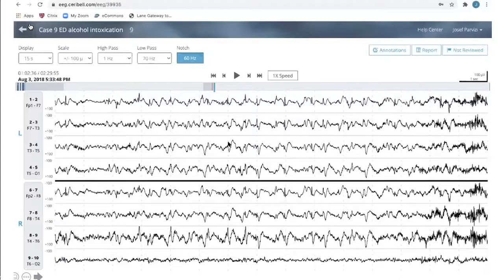And so one expects some variation within seizures. It's not going to be the same exact wave every single time. So another clinical pearl is that if something looks exactly the same with each occurrence, it may not be cerebrally generated. As being a pearl to accompany the one of, if you see it only in one location, one electrode, it may not be cerebrally generated. But okay. You're using variation, which makes it more plausibly cerebral. Great. Okay, I will stop sharing.